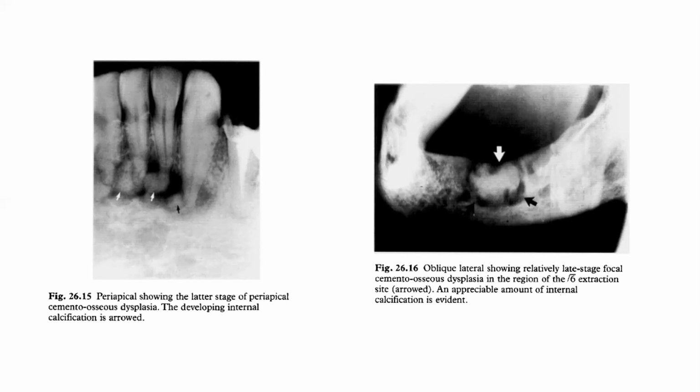In early stages, it starts as a radiolucent lesion, but then as it matures, the opacity increases and becomes densely opaque in its later stage of life. The adjacent teeth do not get displaced, they do not get resorbed. Teeth are typically vital with intact periodontal ligament space, but the lamina dura may be discontinuous. And also, there's no expansion of the jaw.